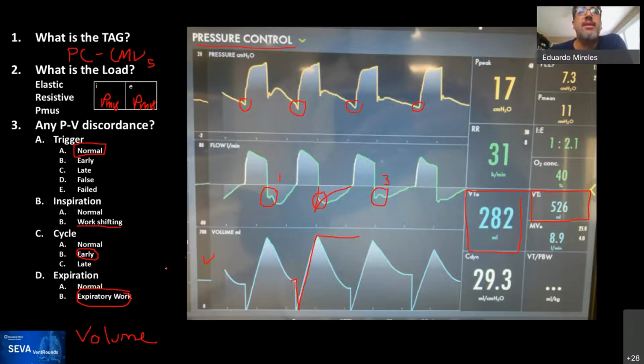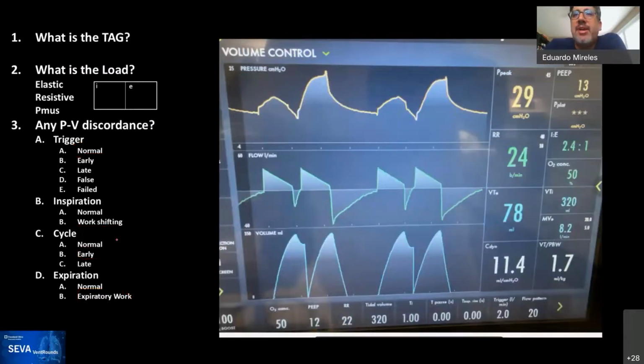Very good. All right, we talked a lot about let it be, let it be. Let's move on. If there are any comments, just put them in the chat or unmute yourself. All right, is there any fellow that wants to read this waveform? Come on, there must be one of our fellows. Amanda, do you want to give it a try? Just for kicks.